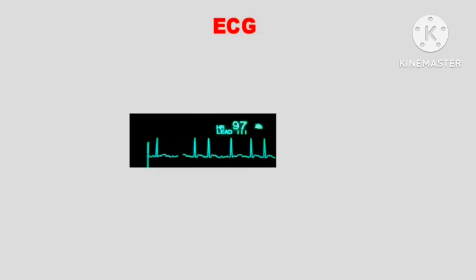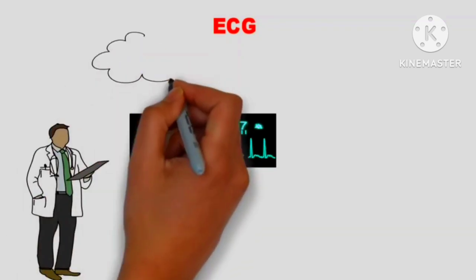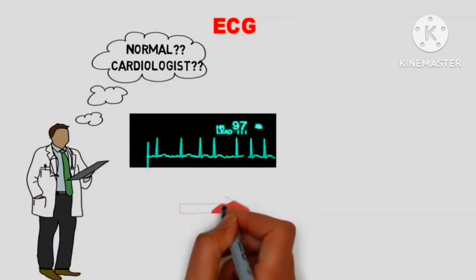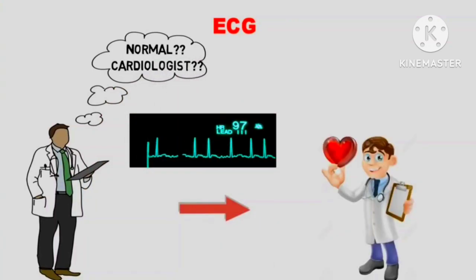New videos. So, today we will discuss ECG. This is by far the most important topic for all the medicos. Sometimes you get confused after seeing the ECG, for example, like this. And you think, is this normal? Should I call the cardiologist? So, in today's video, I'll try to make ECG very simple in only 10 steps. And in the end, you'll be able to diagnose the majority of heart rhythms on your own.